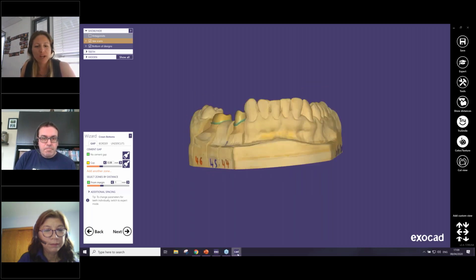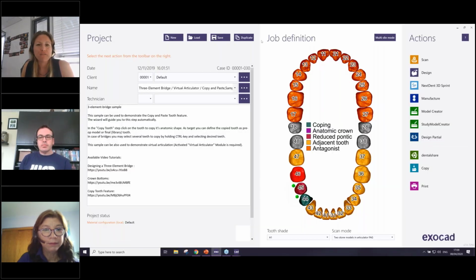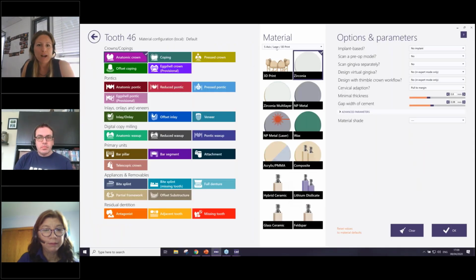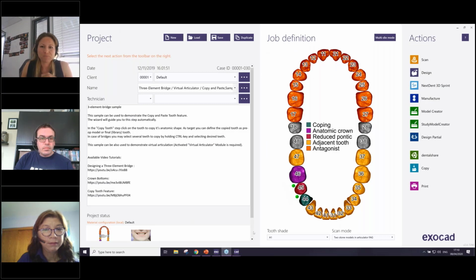If you would like to have this step, you can set it to 3 and 4 axis. It's not a problem. It's always possible to set it to 3 and 4 axis, and if you mill it in 5 axis, it's okay. But if you have set it to 5 axis and you mill it only in 4 axis, maybe it will not fit in the end. That's the important point to know.